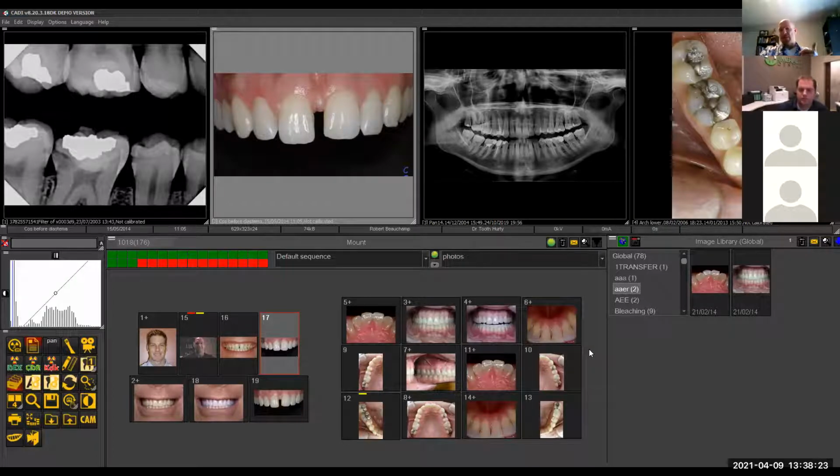Yeah, I mean, that's where, if you are using it for AACD or whatever, and you need to have those original images, that's where we would just remove that little check mark on automatically erase. And then that will, pretty much, what case you're going to be preparing for that, right? You're going to work on that case so many times.